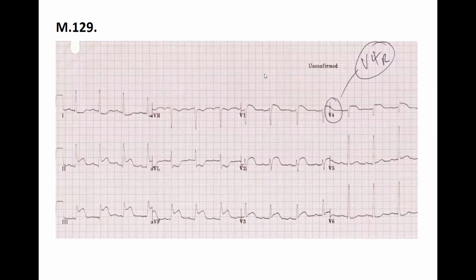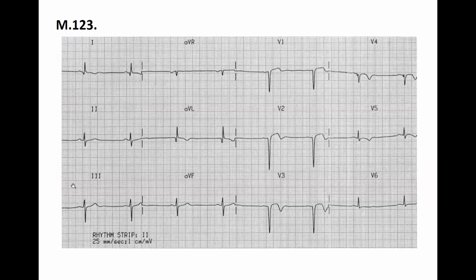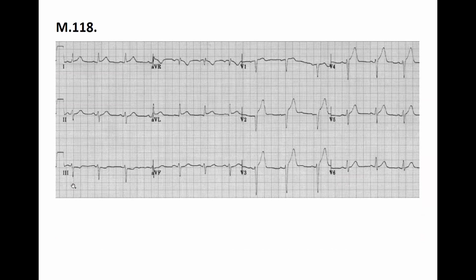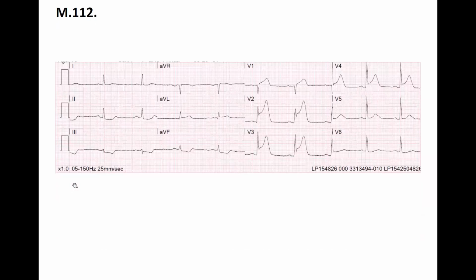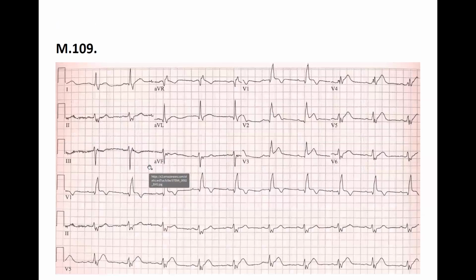Well, if not, let's go back to the beginning and we will evaluate the ECGs that we have. Others don't want to see anything, it's fine. Now, let's go back. What was the last one that we saw? I think that was the last one, 112, yes? Let's go a little bit further.